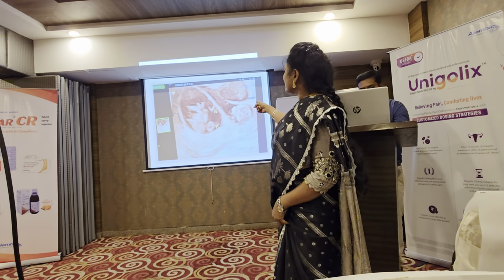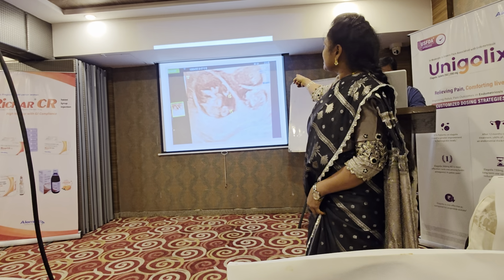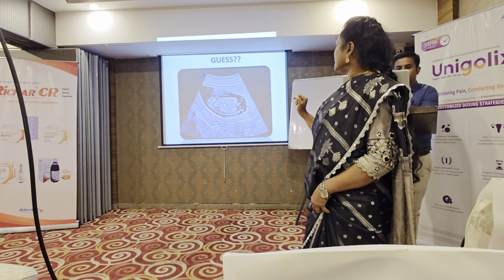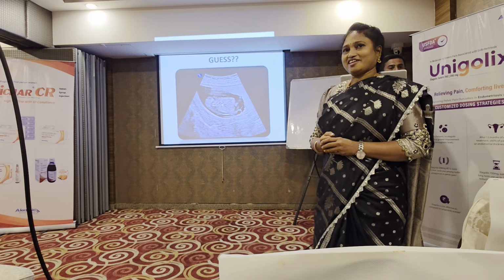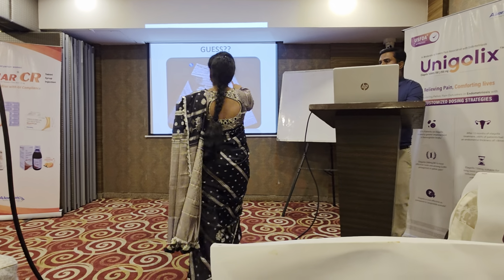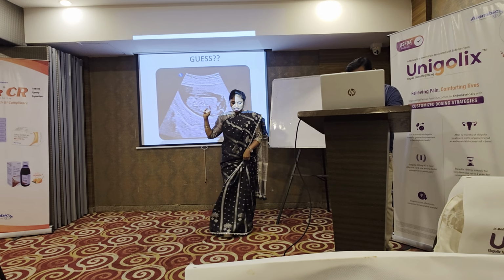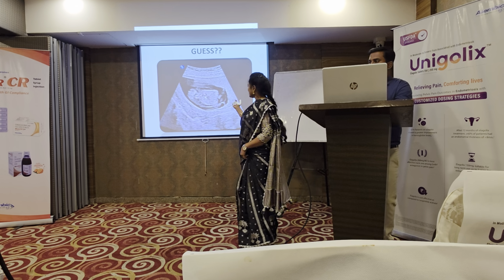So this is a clear-cut case of mono twins on one side, and on the other side it is dichorionic diamniotic. Next one. Same thing. Next one. So can anyone tell me what this is? Whenever you see something this big, such a huge one and so long, this was around 8 to 10 weeks, so it has to be Siamese twins. Next one.